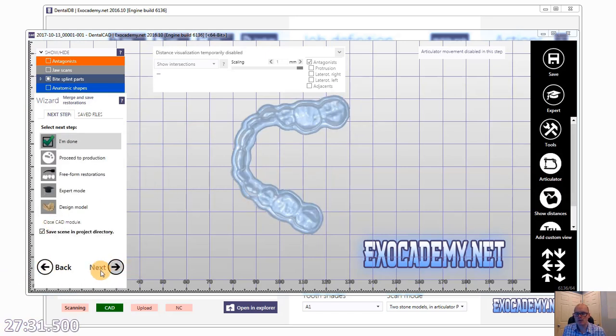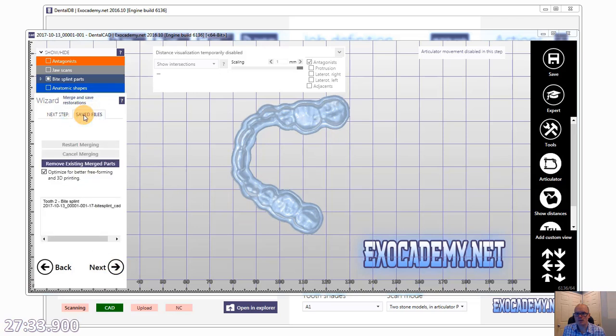Again, we go hit next and then click save files, and we just double click here to access our STL and print or mill.